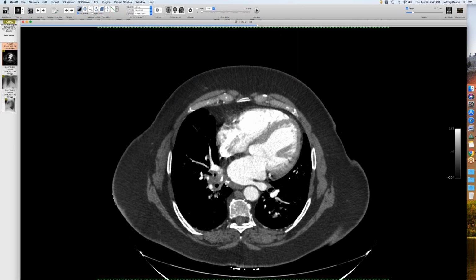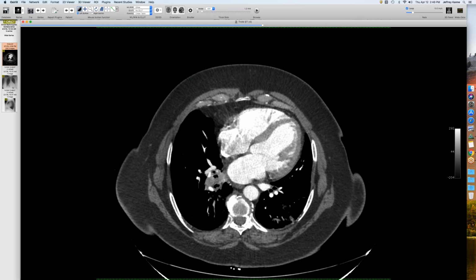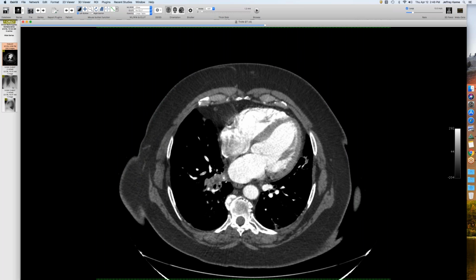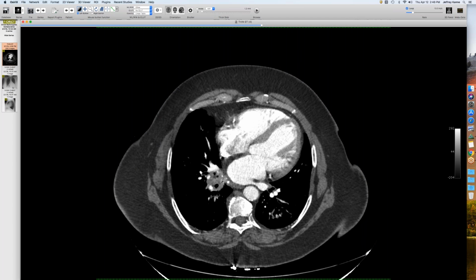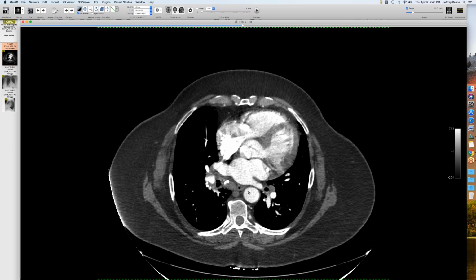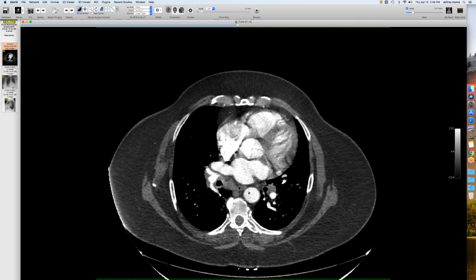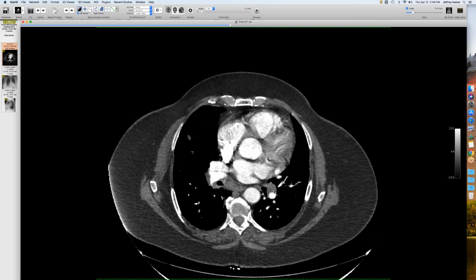Okay. Well, the clue to making this diagnosis here is the absence of the inferior pulmonary vein on the right. I mean, there's absolutely no vein in that right lower lobe. I'm pretty sure I showed this one recently. There's some narrowing of the airways as well, but it's just a variant of mediastinal fibrosis, presumably from old histoplasmosis. What's unusual is there's some contralateral lymphadenopathy.